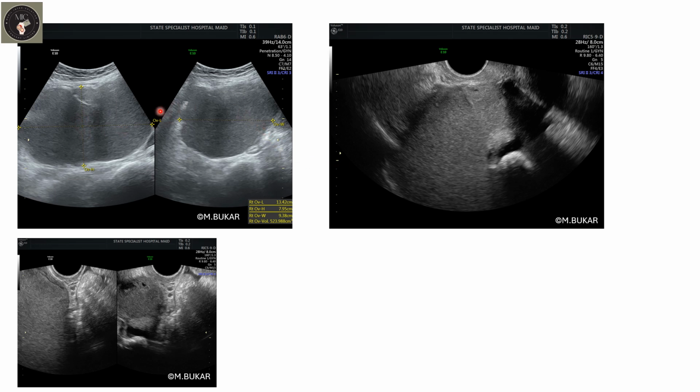So look at this still image on transabdominal here. Look at the size, more than 10 cm in diameter. So one cannot even use the modified simple descriptors here. On transvaginal imaging, look at this ground glass appearance. But somewhere here you can see the extensive shadowing.